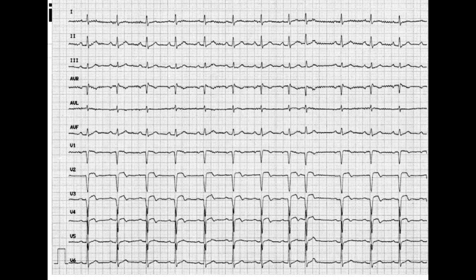And in this case, it would be supraventricular because it appears very similar to the other QRS complexes, all right? And getting back to the other descriptions, it's a sinus rhythm because in AVF you can clearly see the P waves, and the beats per minute is 72.